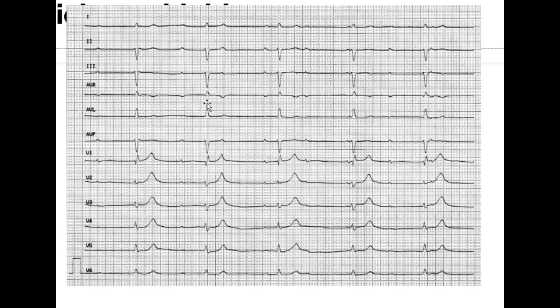In some cases, you might have two P waves between each QRS complex, or you might even have a P wave just next to a QRS complex. It doesn't follow any sort of trend. So yeah, this is a third degree AV block with idioventricular rhythm instead. Regarding its heart rate, it's 32, so there's some sort of bradycardia as well.